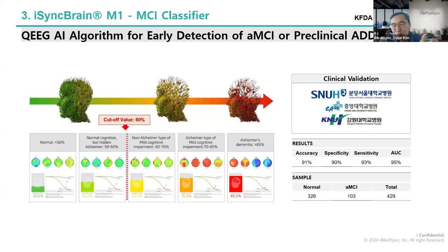I will give you the demo after this part, before going to the quick summary and MCI result. We need to review the clean data, and once the clean data is perfect, then we can use the quick summary or MCI report.